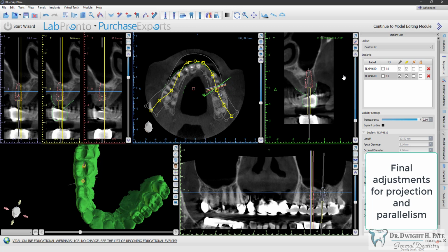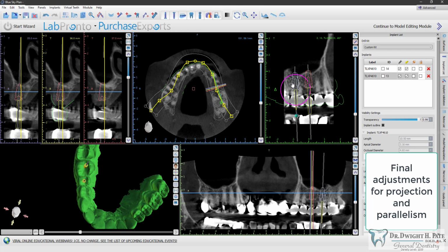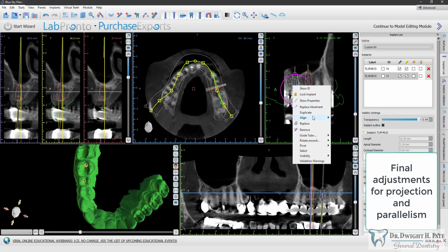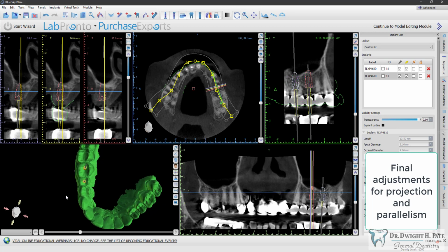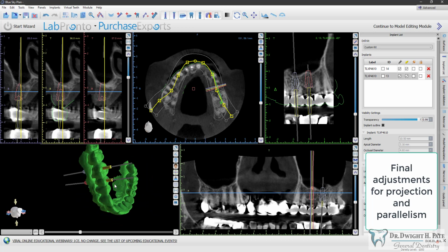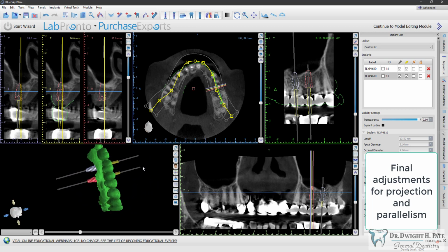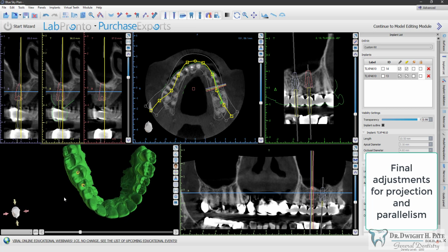And then eventually I'll take all this information into Excel and produce the treatment schedule that I need. Now, the purpose of going through this is not to create a surgical guide. I do not intend to place these implants in an immediate fashion. I'm going to extract and graft the number 14 site, develop my site, and then come back at a later date and place the 2 implants, and then of course restore them.